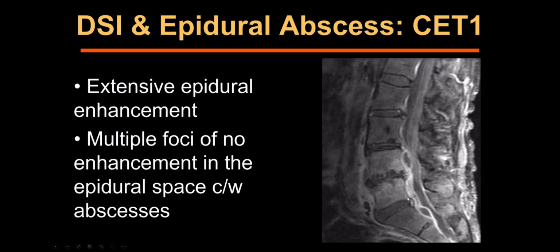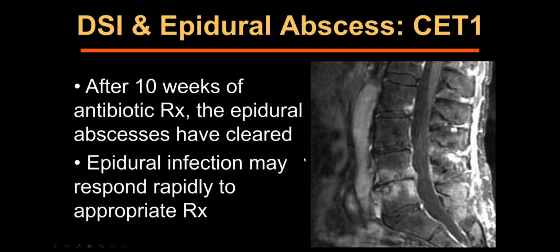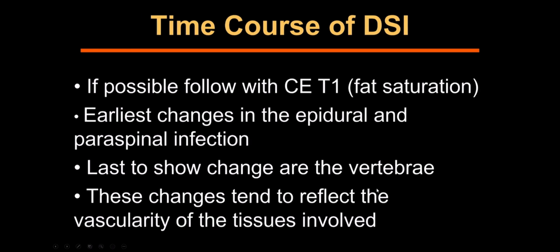Let's look at another case. Here we've got a multifocal epidural abscess. 10 weeks this time of antibiotic therapy. Obviously, that was a pretty nasty infection. And look what's happened. The epidural component is much reduced, perhaps cleared away. So your eye should go to that epidural space, even when you have abscess. If you have prolonged antibiotic therapy, you can clear that infection.